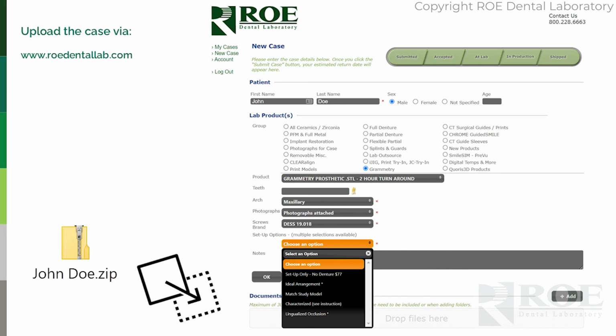We have a bookings page, which I'll reference here in just a minute. And this will be a link so that you can pre-book your surgery. We don't want any surprises. We want to know when you're going to be in surgery, so you'll let us know. Okay, we'll get to that there at the very end. This is where you upload your files.